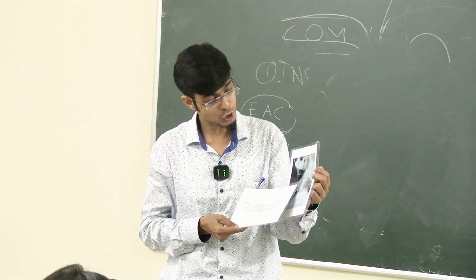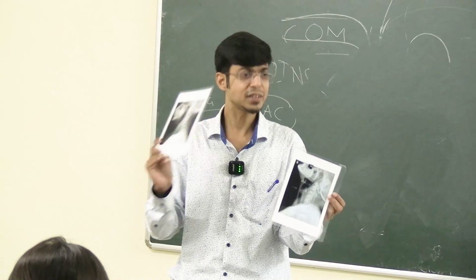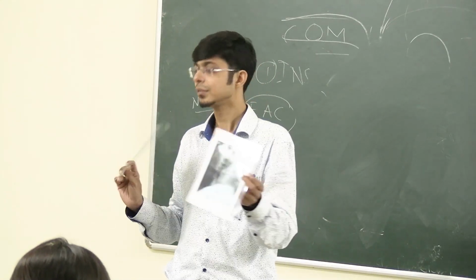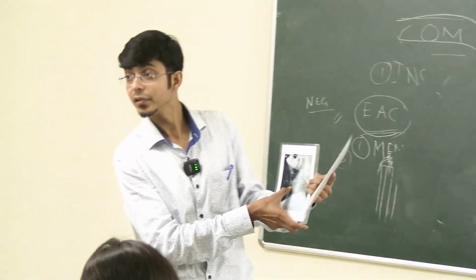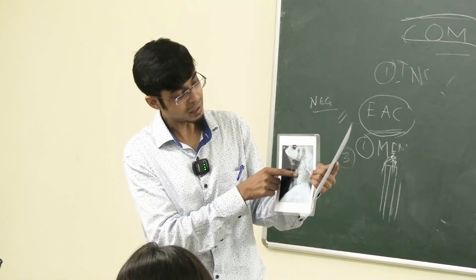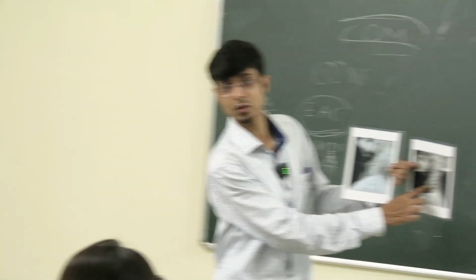Okay, we can see some radiopaque foreign body in the esophagus. It can be a fishbone, a mutton chip, you do not know. Unless you take it out, you do not know. Just say it's a foreign body, radiopaque foreign body. About that, try to understand the difference. That's why I gave these things to you. See here, the trachea we can see anteriorly, esophagus is posteriorly. See the bulge this one is having, and the bulge this one is having is different. This bulge is way more.